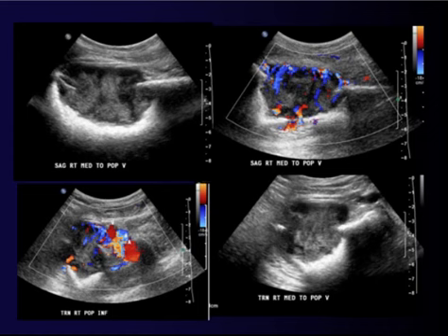This doesn't occur very often, but this patient did present with lower extremity pain. No deep venous thrombosis was found. However, there is a mass in the tibia, which is invading the cortex and is within the marrow. There's a lot of vascularity to this mass, and this was a Ewing sarcoma diagnosed during a lower extremity study.